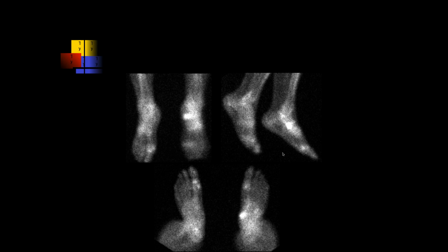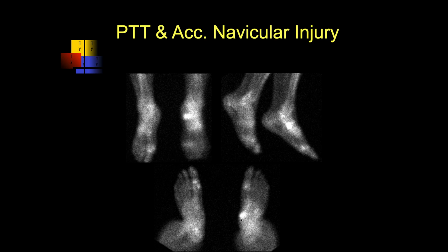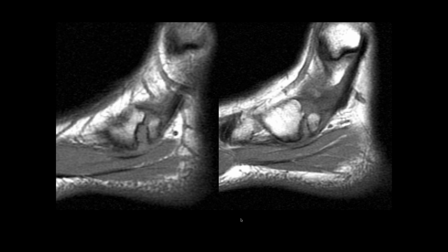And then in the old days, we would do bone scans, and you can see some uptake here of the navicular, medial aspect of the navicular at the posterior tibialis tendon insertion. We don't do that anymore. Okay, Michael.